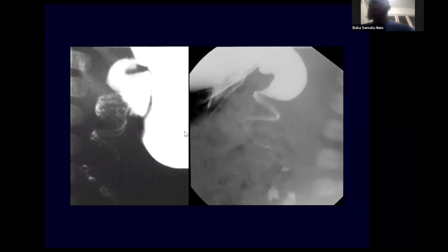If there's a volvulus as the cause of the obstruction, the typical findings on the upper GI are a beak sign that you see over here, and then the corkscrew sign of the volvulus as the contrast goes through the loops that are actually volved. In this one, you don't see the beak, but you do see the corkscrew sign of the narrowed bowel as the contrast gets through it. Notice that both of these images are taken with the vertebrae showing that the patient is in a lateral view.